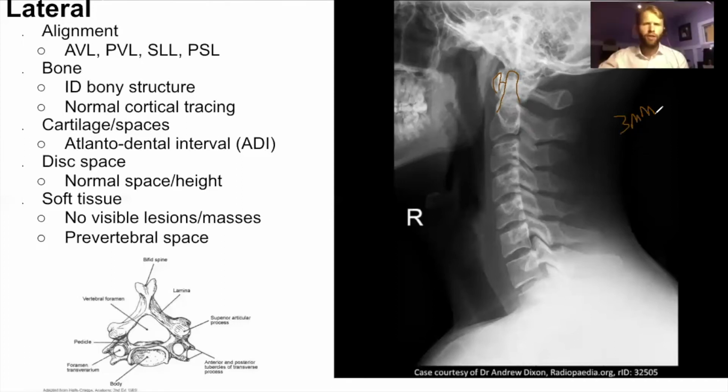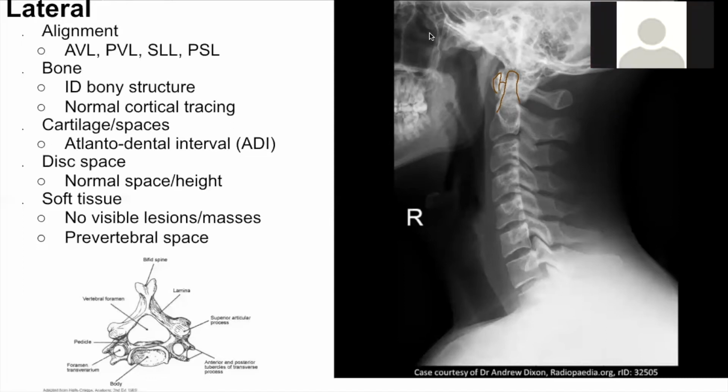Do you mind just saying the reason for that, Ken? Because you're going to have atlantoaxial disruption. Is that what you're asking? Yeah, essentially that if you see a space greater than that, were you about to get to this, by the way? I didn't want to preempt you. Yeah, I have another picture after this. Yeah. Sorry. Always stealing my thunder. I was ready for it. As if I don't have access to the slides before.